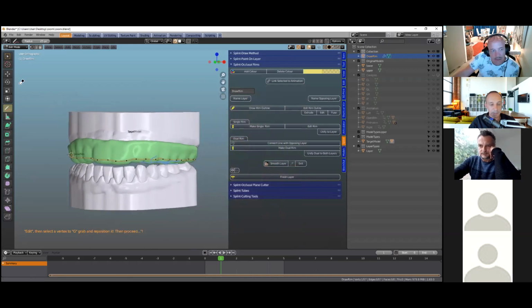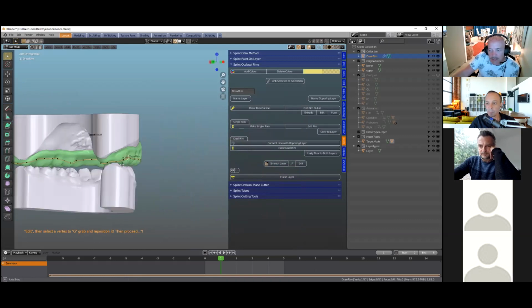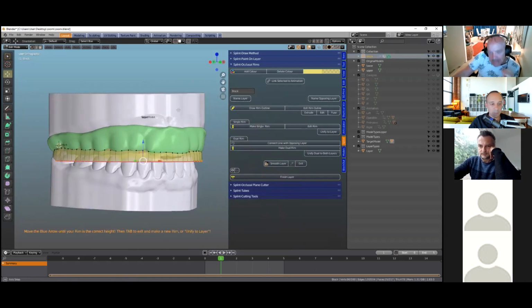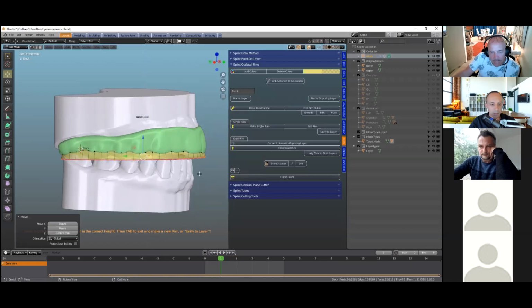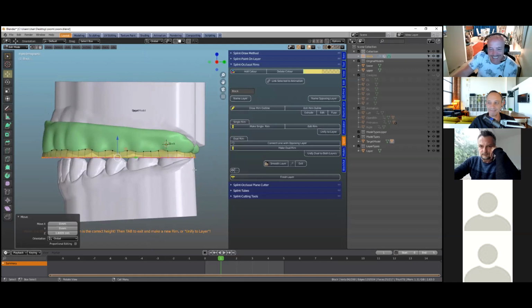So I'll just delete this like that. Okay, so now that we've done this, we're going to click on Make Single Rim. And like we've said earlier on, the lower would come out inside the green layer, so we would just pull it up. Now I can view this, say, from the left. I always view this from the right, and orthodontists love viewing it from the left, and I always get confused. So anyway, we can rotate this a little bit if we want to.